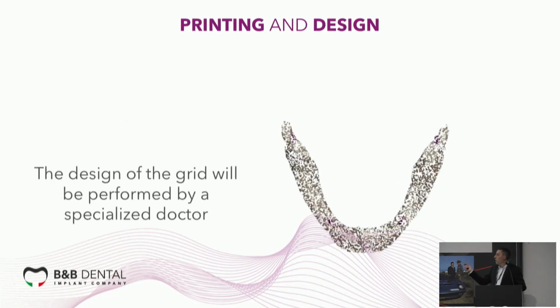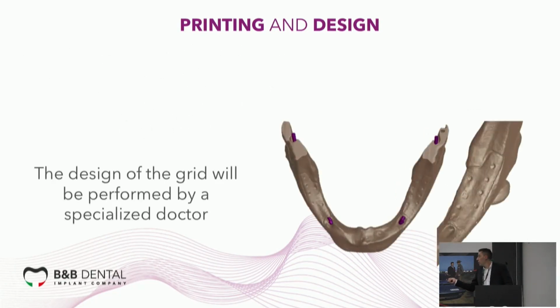After that, we need to do the design of the Juxtagrid. Okay? If you want, you can perform the design of the Juxtagrid in your country by yourself, or otherwise we have some doctors that can help you to design the Juxtagrid.